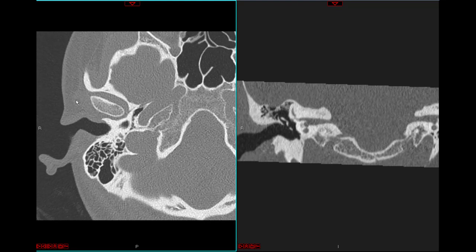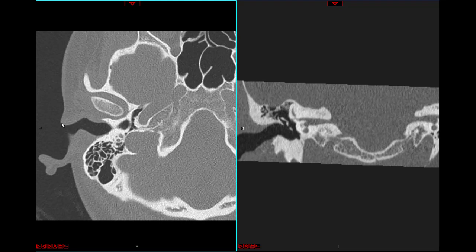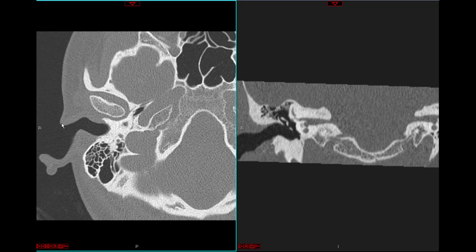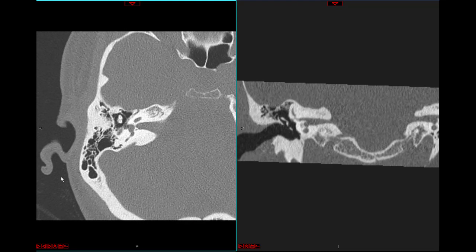So just a little bit of anatomy of the external ear. This is generally going to be considered surface anatomy. I don't think the radiologist plays a huge role in this. There are cases in which you're going to look at infections and tumors of the external auditory canal, but certainly the external ear is fairly evident to your clinicians. But there is some anatomy that you can appreciate.